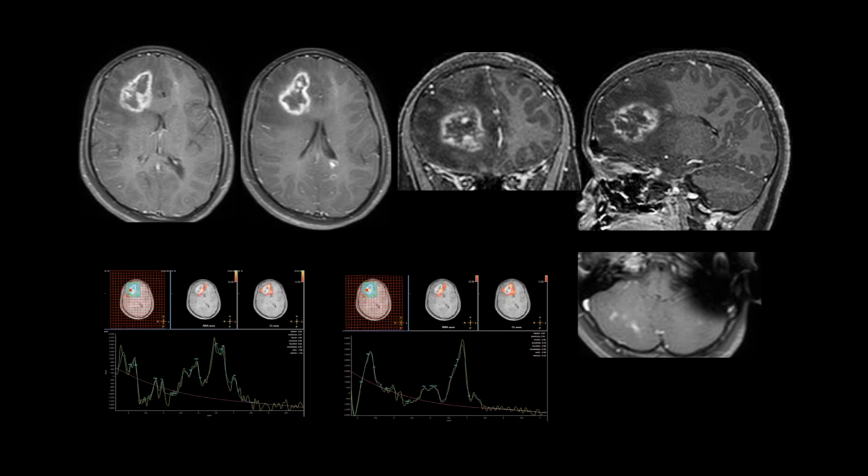Except for a few infections, particularly TB, we saw from South America as well, and from some of the centers in Mumbai, particularly with our initial COVID collection. Yeah, the TB was presenting in a very malignant, very aggressive fashion, as you can see here, lots of tumefactive kind of process going on.